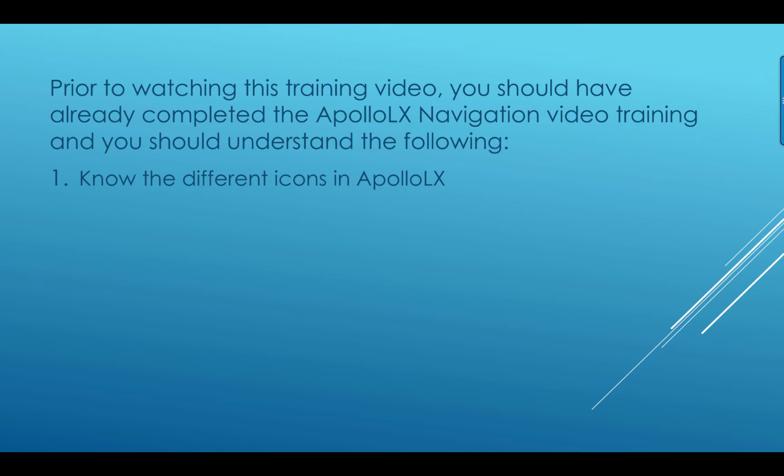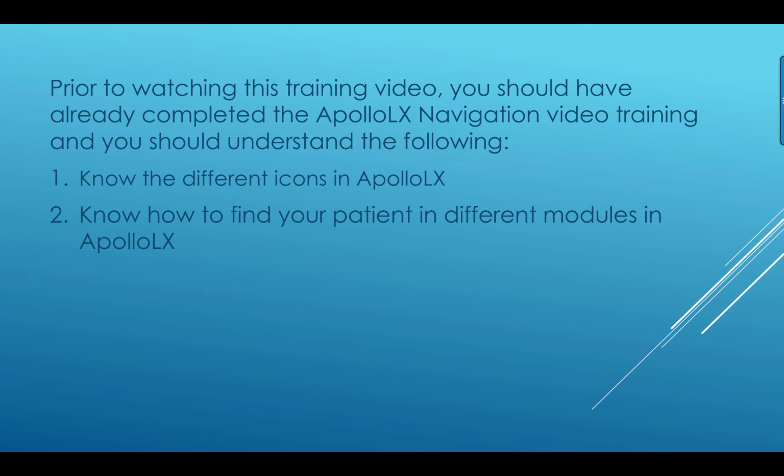understand the following. 1. Know the different icons in Apollo LX. 2. Know how to find your patient and different modules in Apollo LX. 3. Know how to navigate through a workflow to edit or add data.